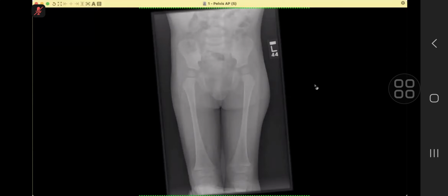Okay, so this is X-ray pelvis and femur frontal projection of the same patient. And in this, sir, you mentioned that the age was 17 years. Yeah. So for a 17 years old, bones are showing a little bit delayed ossification.